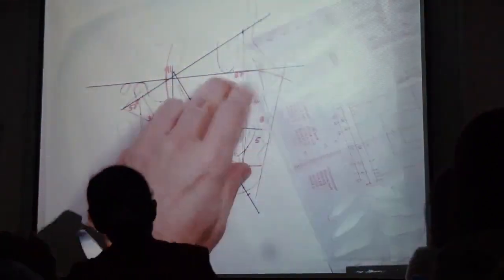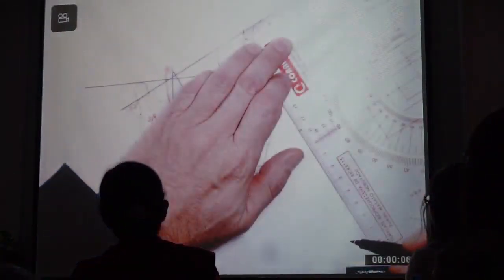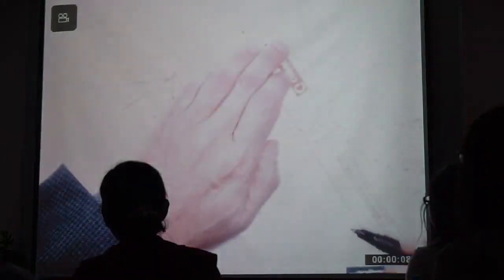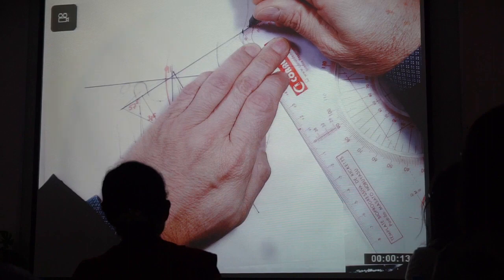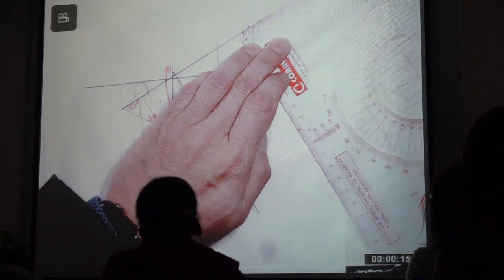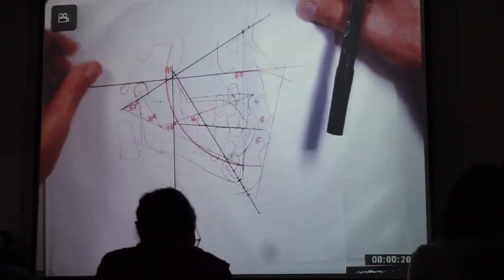So now I take my ruler and I add 5.6. Yeah, 5.6. Because you had the camera below to your head. Your head goes to I'm sorry. Oh yeah. Okay, 5.6. Đây là it's almost here. Cho nên thầy vẽ ra. Okay, now I am going to put.